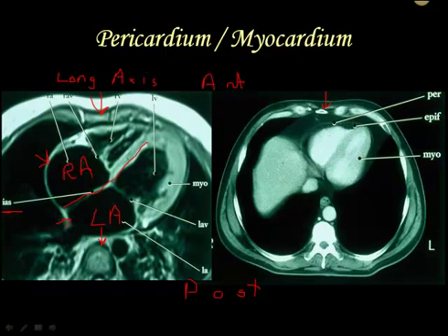Now, moving on, from the right atrium into the right ventricle, and you can see the little arrow here is pointing down to here. There is the interventricular septum right here, and there is the left ventricle. Now the ventricles do more work than the atria does, so it stands to reason that the myocardium will be greater. And not only that, but it's going to be greater over here to the left than it is to the right.